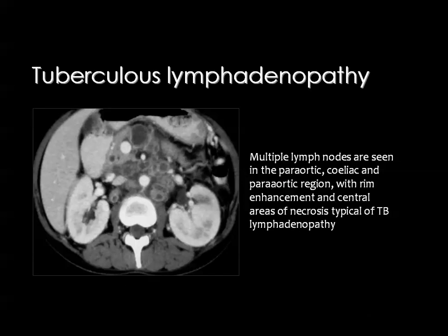And this appearance is known as tabes mesenterica or tuberculous lymphadenopathy.